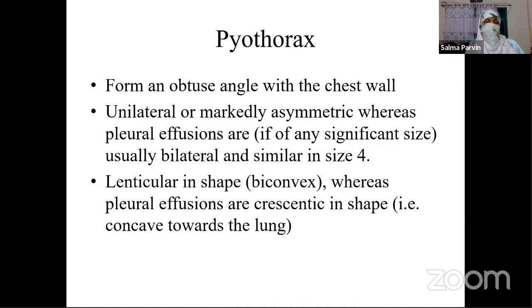And lastly, I need to go through another part in association with the malignant and benign effusion. This is about pyothorax.